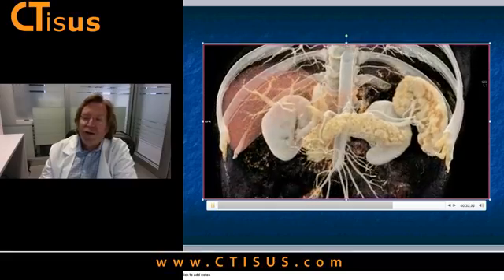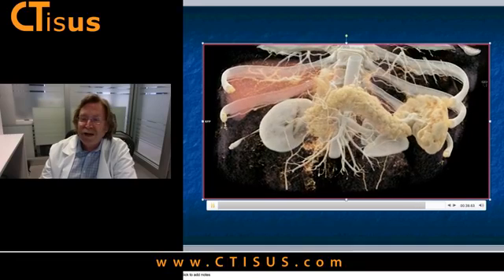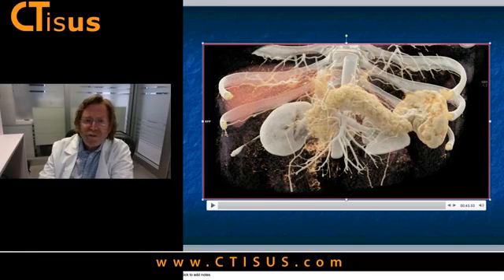I think with robotic surgery, Da Vinci becoming more and more mainstream, this has tremendous opportunity. Look at the detail of the gland, but also the orientation of the gland to vessels. And again, imagine this with spread of tumor. And so, just very, very impressive renderings.